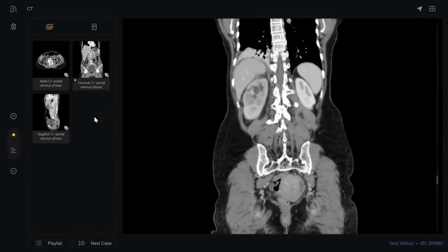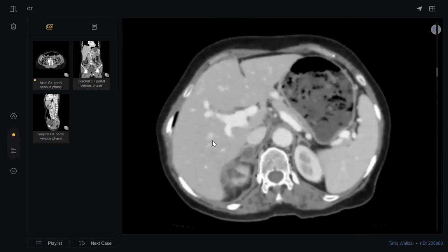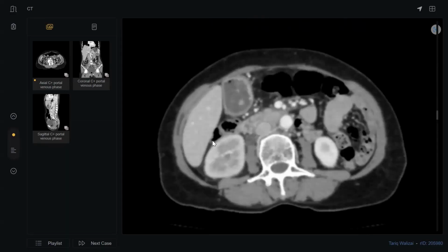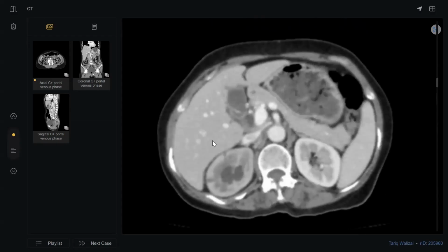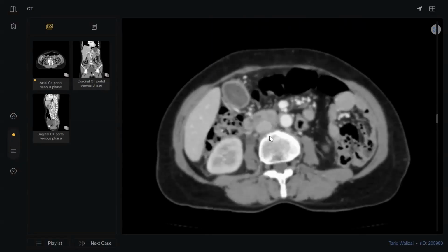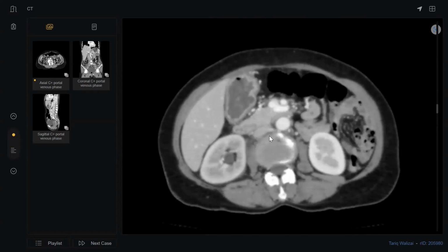Take some home advice, doctor. In all trauma cases, my colleagues, we must ask the examiner for delayed or excretory phases. We should tell him, doctor, we want to rule out any collecting system injury. If I see contrast spilling outside here, there is a collecting system injury, and it will make the degree different.